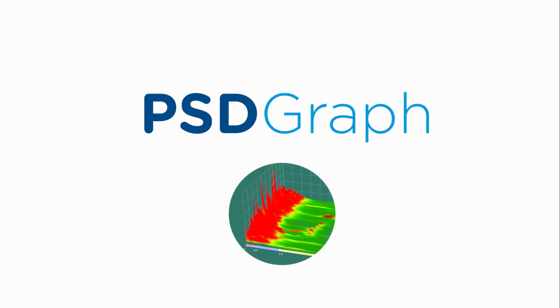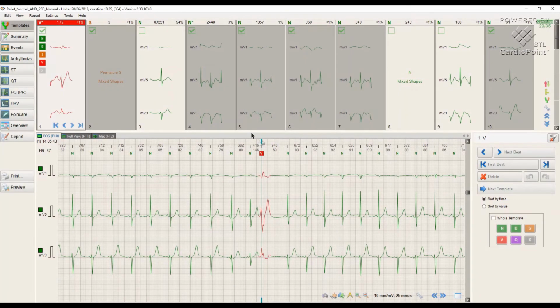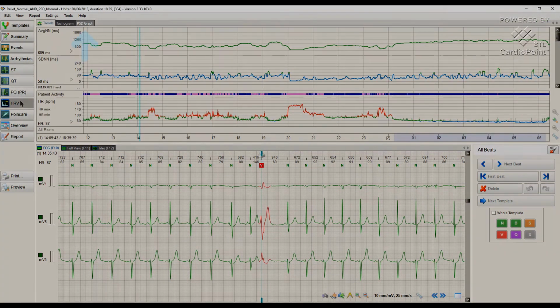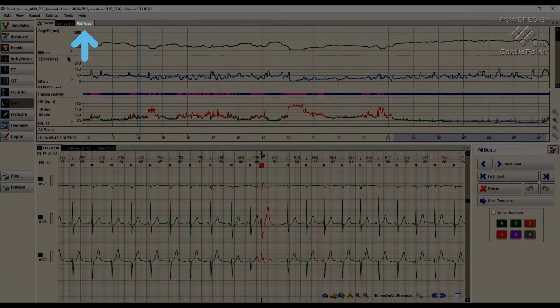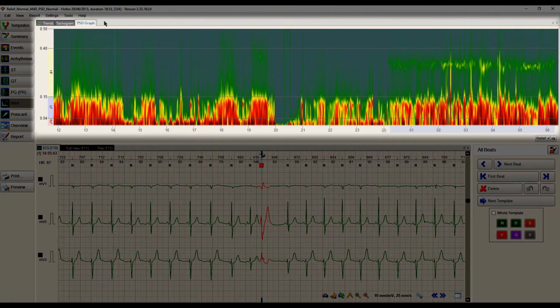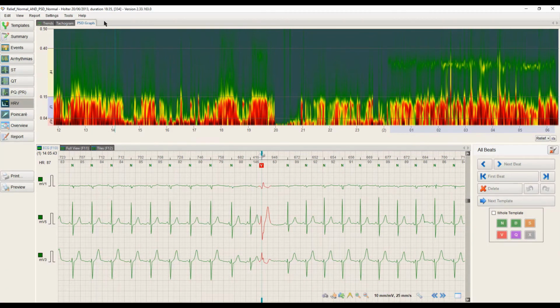And the last tool to explore is the PSD Graph. PSD, or power spectral density, is an instant diagnostics of the autonomic nervous system, which helps us to identify burnout or overtraining syndromes, sleep disorders, regeneration process dynamics, etc. This method is very applicable both in clinical and sports medicine to assess the quality of training and recovery processes. The PSD module is a visual representation of heart rate variability frequency analysis, which makes it fast and convenient.